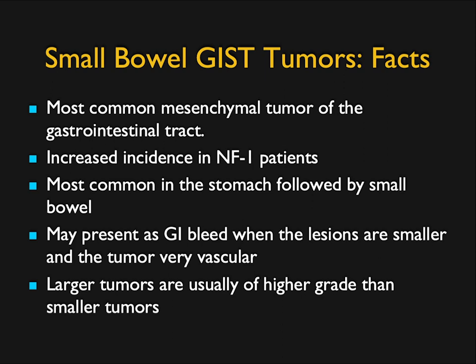The larger tumors are usually of higher grade than the smaller tumors, and because we're so good now in picking up these tumors, there's a question how to manage the patients. Does everyone need surgery? It's very much like the issues with neuroendocrine tumors of the pancreas, where we used to miss 70% of them, and now we pick up 98% of them, and we pick up many incidental lesions. So as imaging gets better, management decisions, in a sense, change.